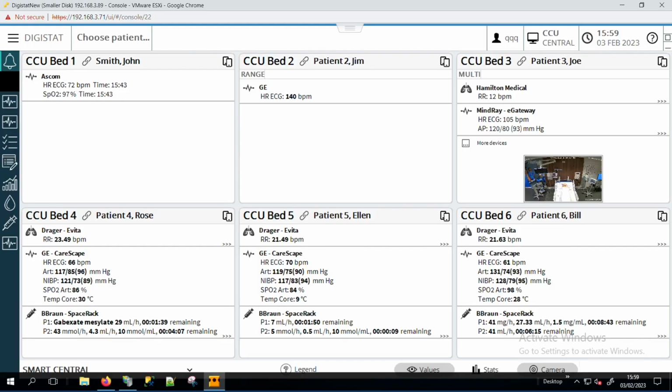Dashboards can be used in different ways to create context around a patient's condition. The dashboard I'm going to show you works well in acute areas where there are a number of patients being monitored in one area. Traditionally, a dashboard on a unit will be a central station showing information from one vendor-specific medical device. But we want to create situational awareness by having all devices connected at the bedside visible on a single dashboard. Our dashboard not only allows users to review historical events with full context, but also view live waveforms coming from medical devices.